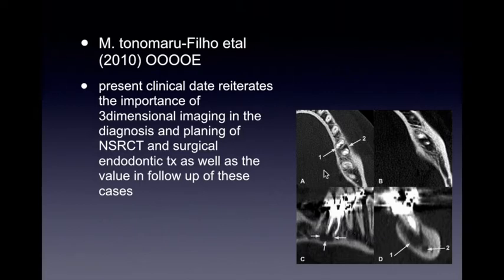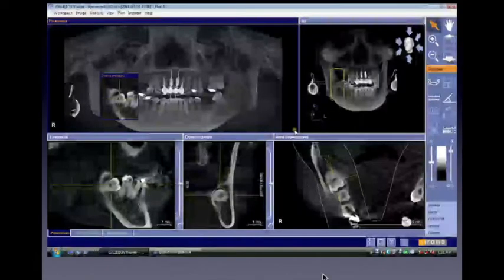So again, in this case, the periapical radiograph did not show anything because you have very clear, thick, intact cortices. On CT scan, it has been confirmed, as the case report has cited, an acutely enlarging mass or infection that is growing through the lateral canal, in between or interradicularly between the roots of these molars. So that's where it is very good.